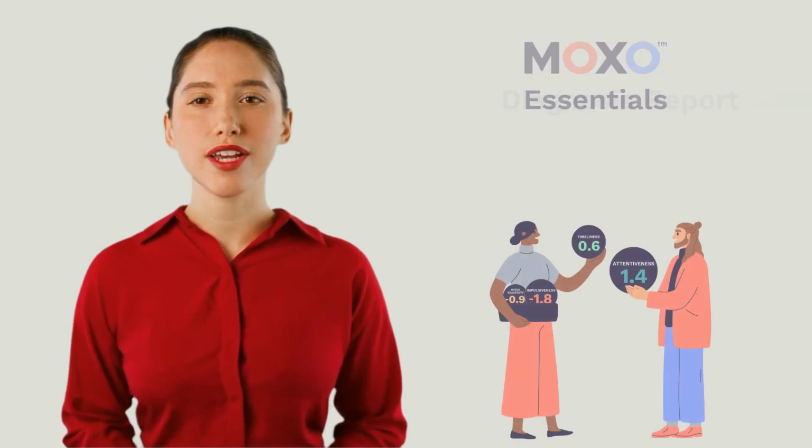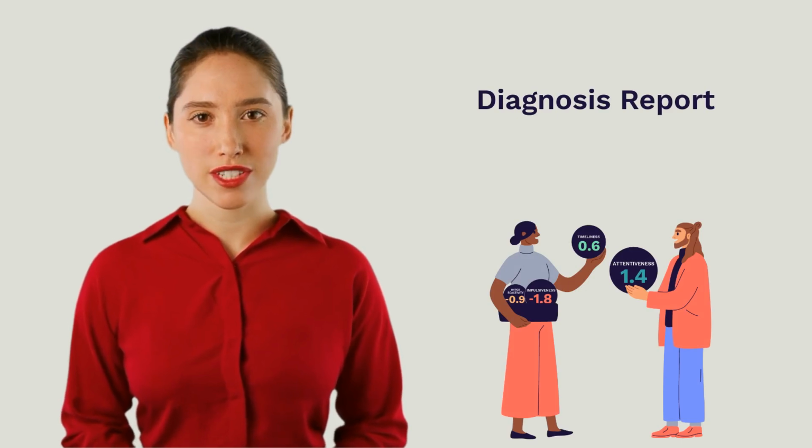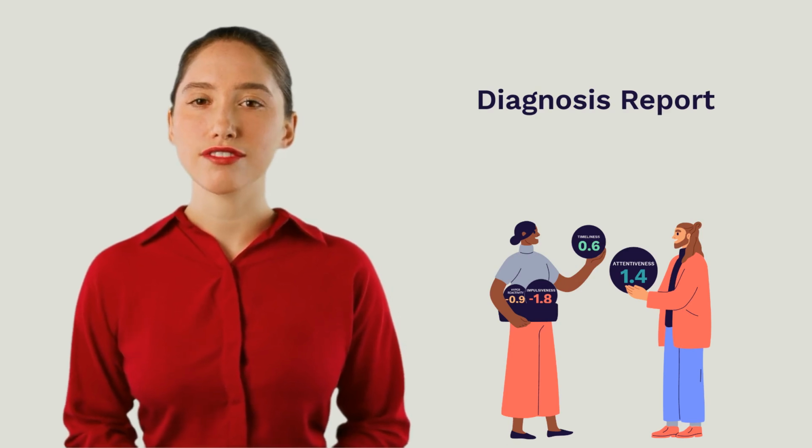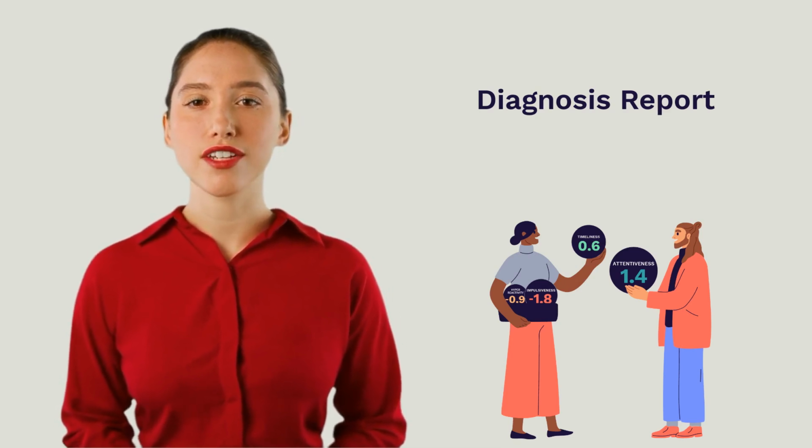In this video, we are going to talk about the MOXO Diagnosis report. Quick disclaimer, any patient information you are going to view in this video is all fictitious and does not represent any client.